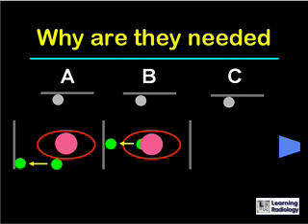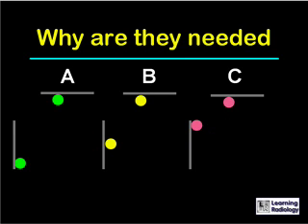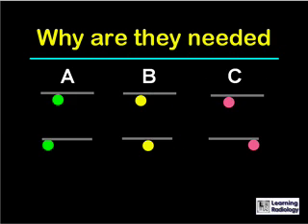Patient B, it's projected in that location, and patient C, it's projected in a different location. Now, if we take the two pair of images, the frontal and lateral, for patient A, for B, and for C, and we look at them together, as we usually do, it is relatively easy to localize where the lesion is.